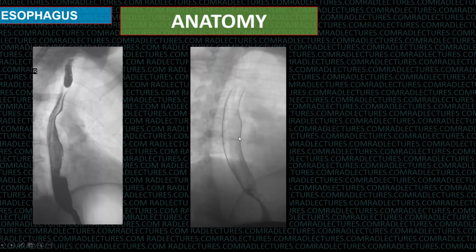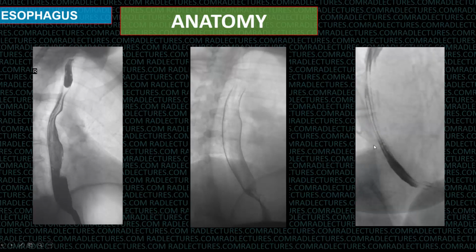In the distended state, in an air contrast study, the mucosal folds are not visible. It is a smooth mucosal pattern. But as it becomes collapsed, that is called a mucosal relief image. In these you are seeing the mucosal folds which are longitudinal in the esophagus. Remember, the folds in the esophagus and the stomach are longitudinal.